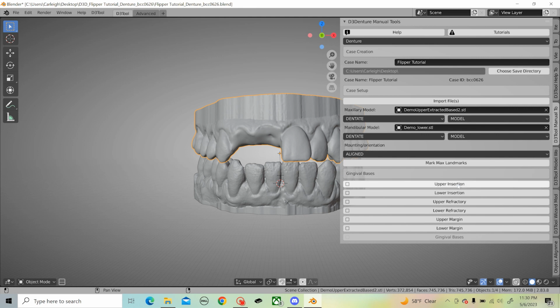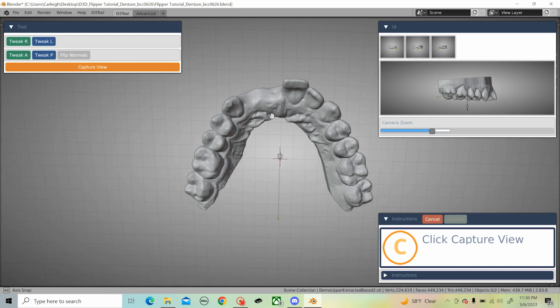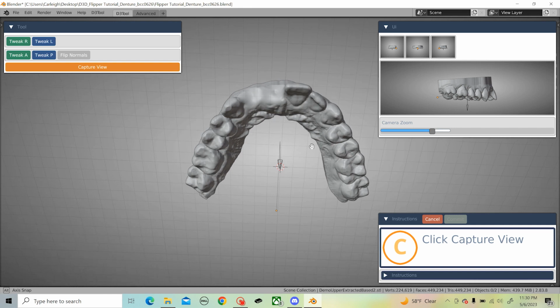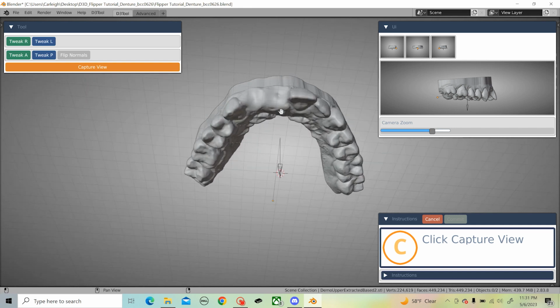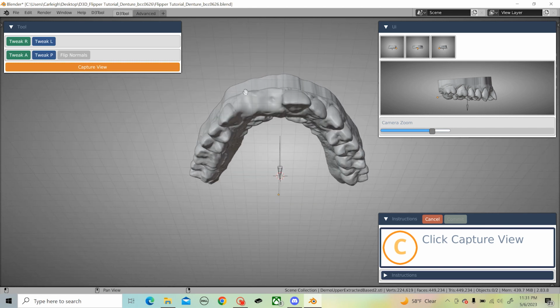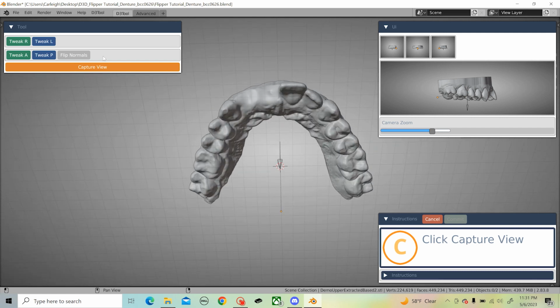I'm going to start by picking my upper insertion axis. Now, depending on if you are doing any gum data by the facial of the teeth up here on this side, or if you're doing a true flipper and it's going to be just the teeth, you may have a more palatal orientation as opposed to a direct line here. So I'm actually not going to do any gingiva on this case on this upper side, so I'm going to go ahead and tilt it back.